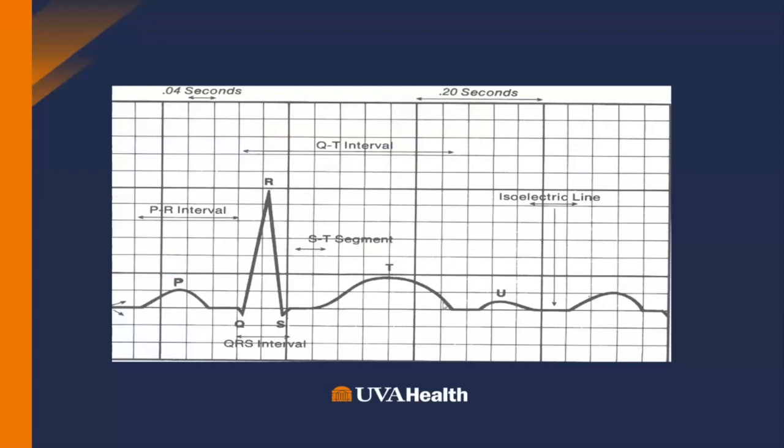repolarization of the myocardium. And then here's where we get really nervous when folks have ectopy, because if they have something called R on T, if you have this happen here, then that can cause fibrillation. That's one of those things that can happen when folks have heart attacks, for example. It's also one of the reasons we synchronize when we cardiovert perfusing rhythms, because what we want to avoid is this: the heart is very, very sensitive during this refractory period. And if we do get an electrical impulse that conflicts with this period of time, then it can cause the heart to fibrillate. It's very fragile.